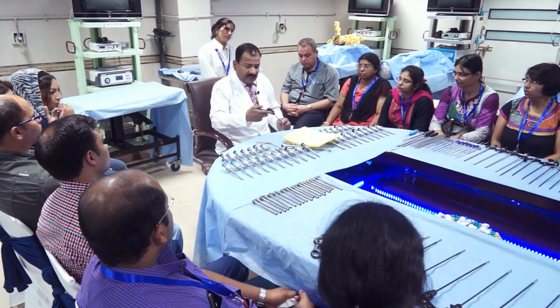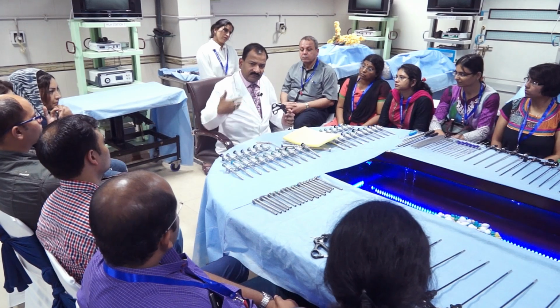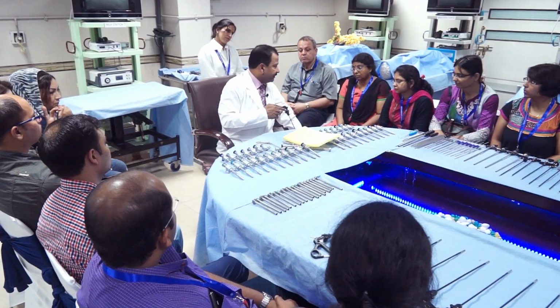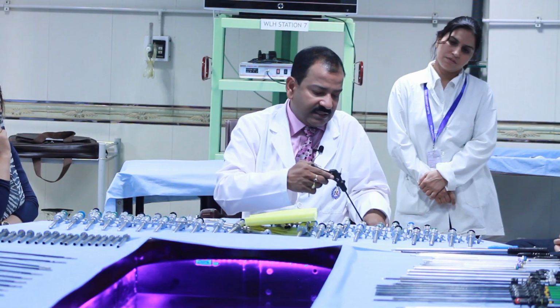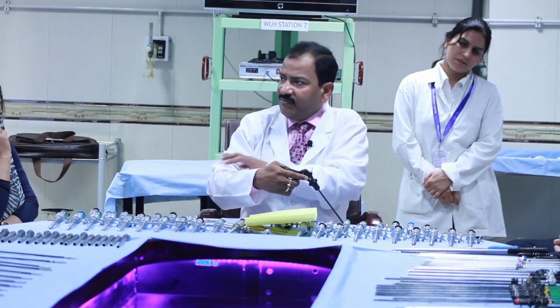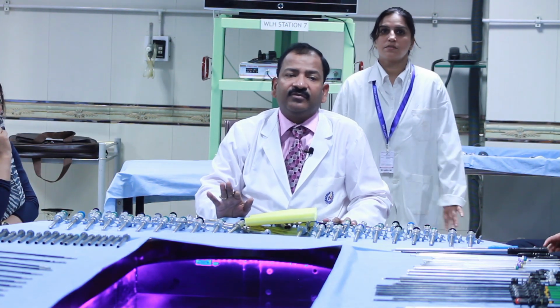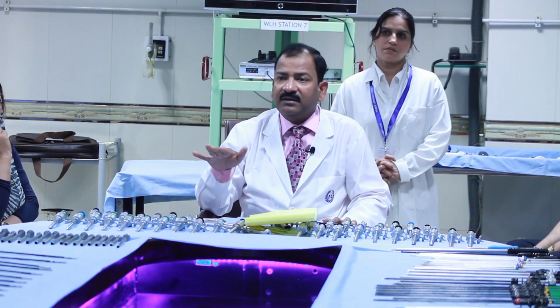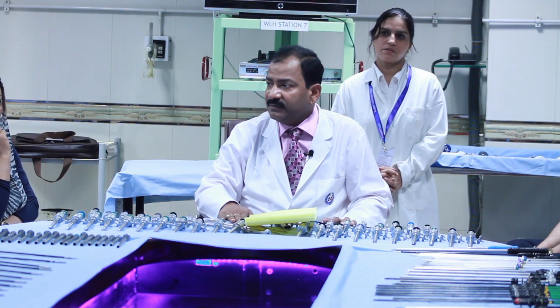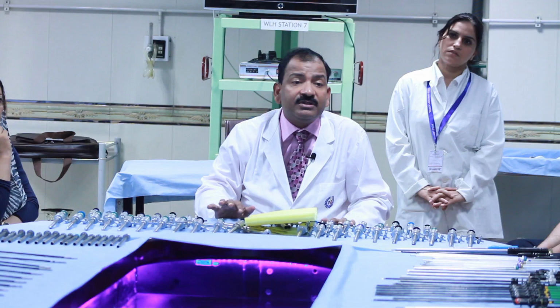Suppose my height is only this much, then according to my height, the table should be here, so that half the instrument is in, half is out, and the handle is at the level of the elbow. Whatever you do in your day to day life, you want the elbow like this, like he is keeping the notebook on the table. Do you know why? So that the notebook is at the level of the elbow, that is why we use a table.